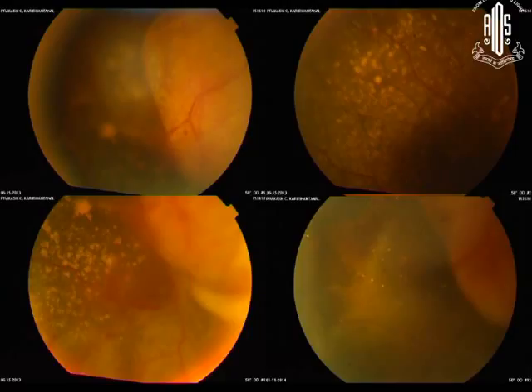Usually astrocytomas do not need any treatment. They just have to be watched. They just have to ensure that it's not retinoblastoma. But very rarely it can be a giant astrocytoma presenting with exudative retinal detachment, extensive subretinal exudates. This is again over the disc. This is a very, very rare possibility or differential diagnosis, which is a giant astrocytoma. This responds usually well to photodynamic therapy.